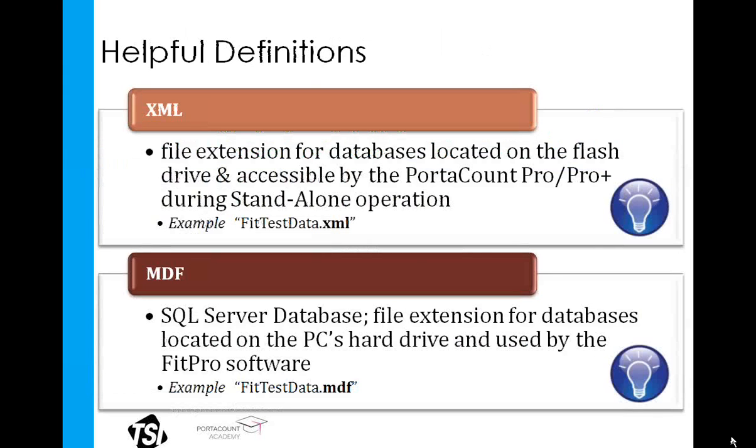Now, as you take some time to look around this window, you may see some acronyms that you're not familiar with, such as XML and MDF. Now, though these acronyms are not imperative to the everyday use of the PortaCount Pro, I think it's nice to at least understand what they are referencing.